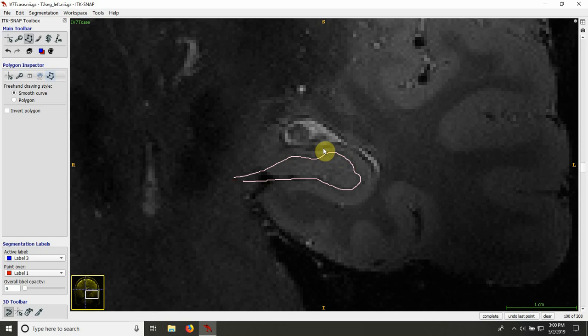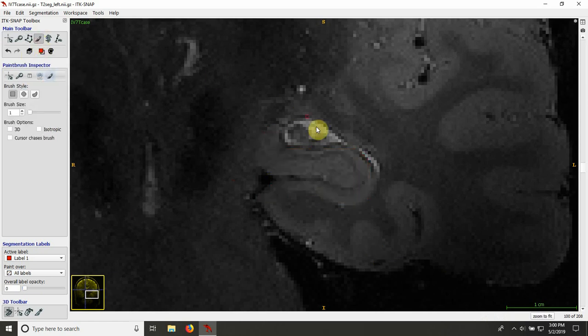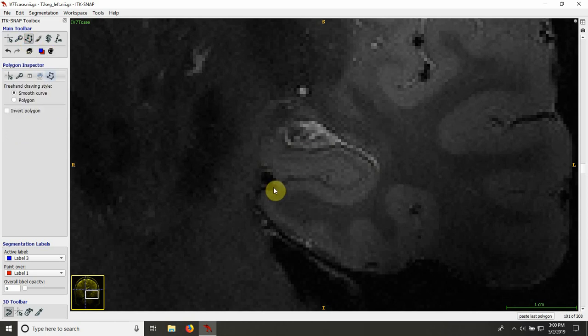You can see how thin this upper layer of CA gets. This slice is pretty much over-segmented, so I just want to adapt that. The same for this slice, following the dark band.